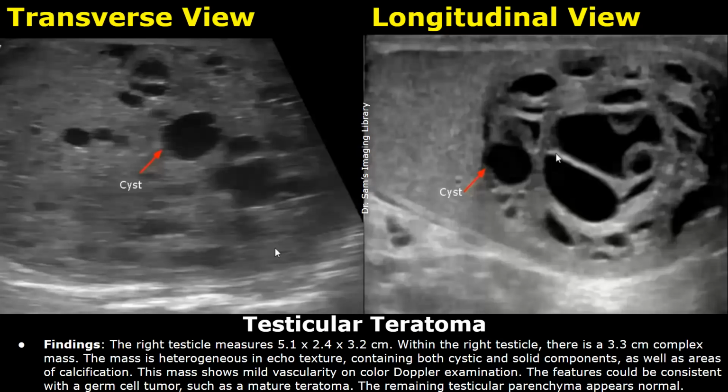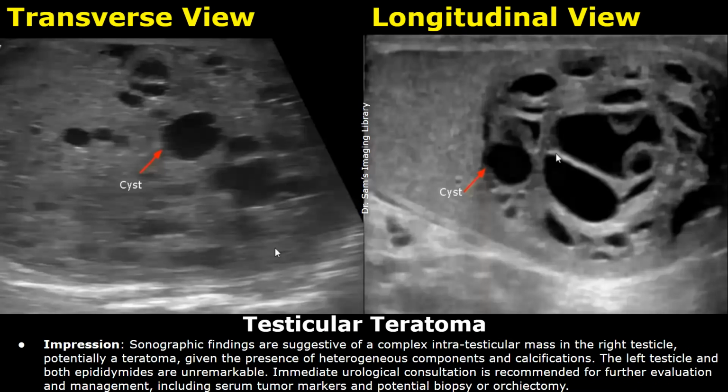The remaining testicular parenchyma appears normal. The main findings are written in the impression. An immediate urological consultation is recommended for further evaluation and management.